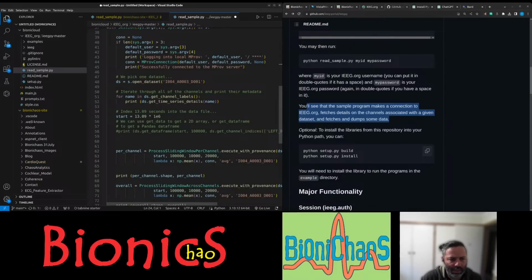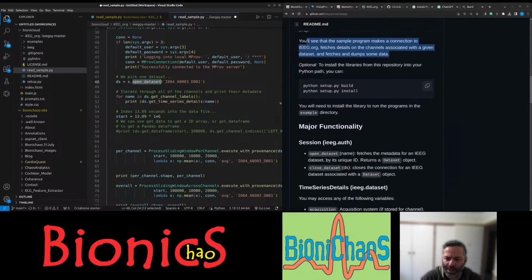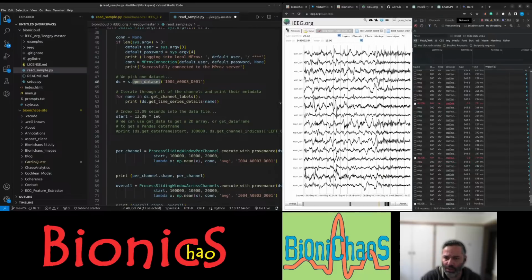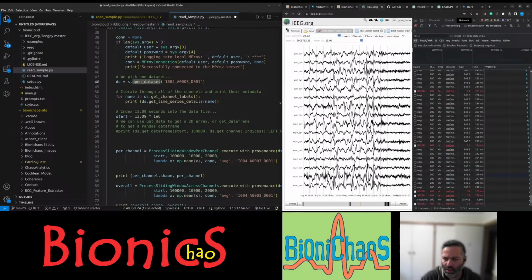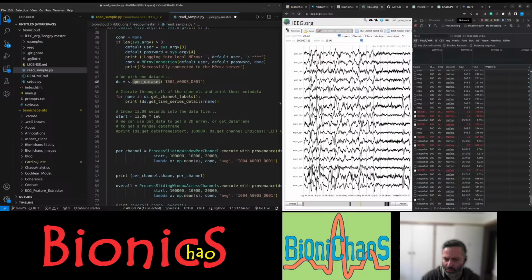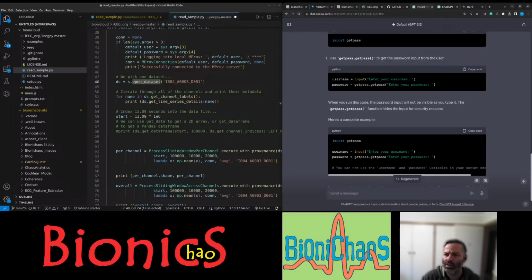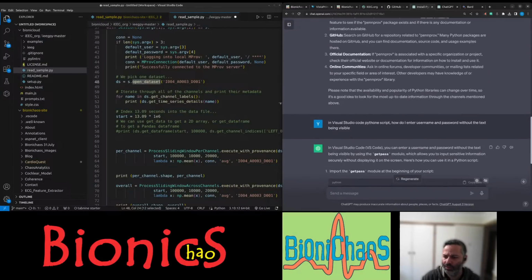Okay, we have the data downloaded. Let me just work with what are the EDF files. Should be able to do that. So I'm having trouble connecting to the server. It's still working. It's working okay.